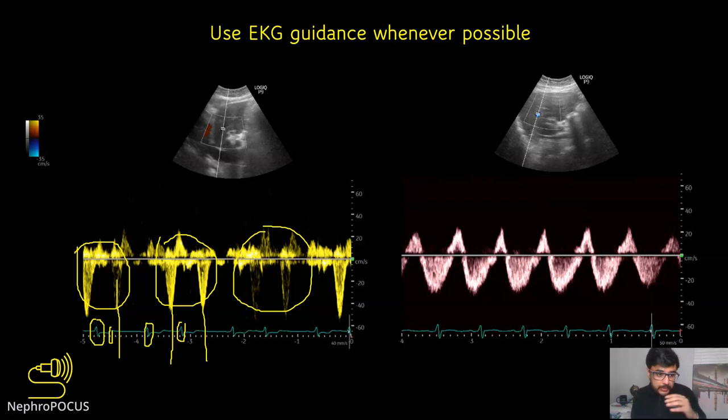So this patient had atrial fibrillation and irregular rhythm. So when patients have these rhythm abnormalities, having EKG tremendously helps. So without EKG, you would think probably it's almost normal waveform, but with EKG, you know that this is severe congestion and there is no S wave here.